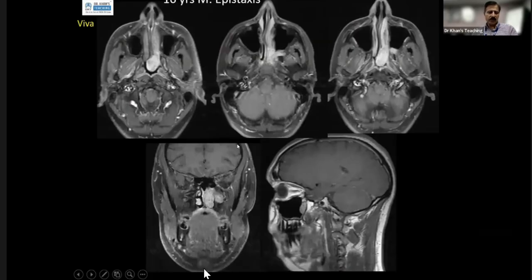So this is a recap of the anatomy, which we have already done last time. But let me ask you leading questions. This is a case of nasopharyngeal angiofibroma in a 16-year-old. These are T1-weighted axial sequences post-contrast. Where are we here?